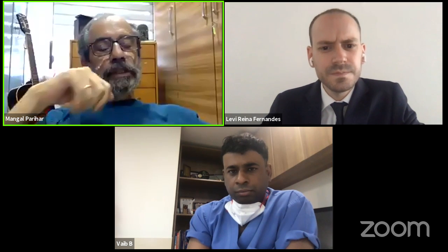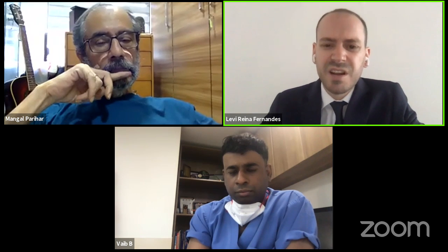Yeah, it's a problem. So you've used this in how many cases now? Well, I've been planning for a lot of colleagues of mine as well, so we've been using it for more than 100 cases already. Okay. So when you've planned on the software, you then also double check it with the alignment rod on the table, right? Yeah, we do that.